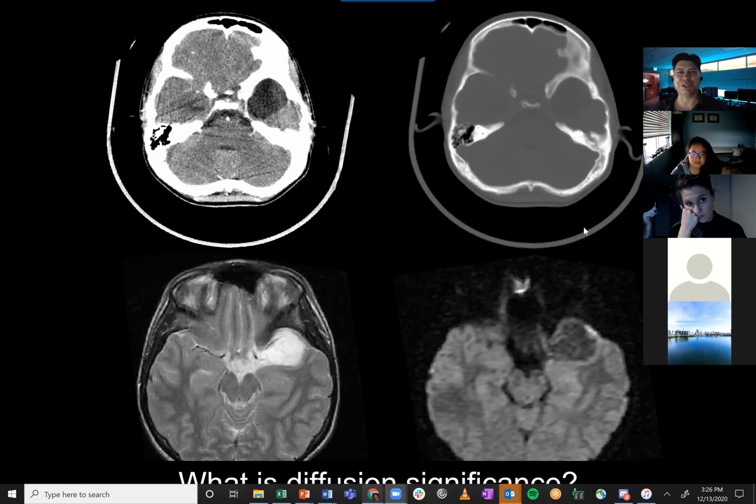At the level of the mandible, the masseter is out laterally and the medial pterygoid is medial to the mandible. But there's a muscle right here that goes in between this space and this space. And it's not the anterior belly of the digastric. So it is the posterior belly of the digastric. That's right.